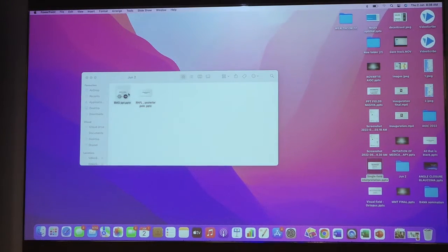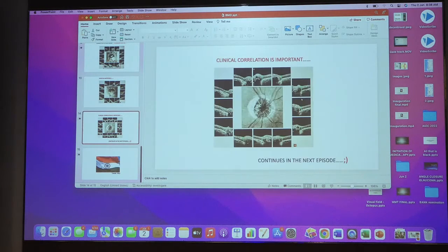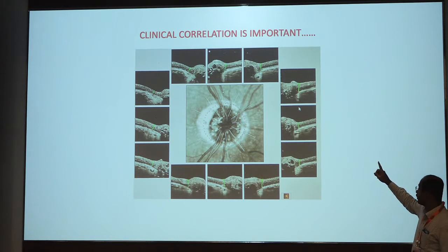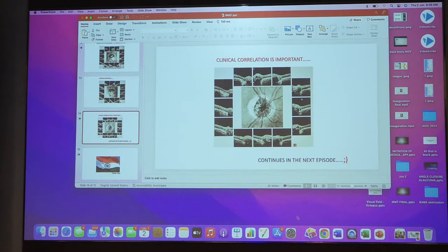So this was the MRW of the last case. Yeah, so all in the green, all statistically normal, all sectors agree, Bruch's membrane opening identified properly, termination, vertical, perpendicular, everything fine, everything normal. Okay, so now I go back to the PPT that I am doing right now, and let's see why Shane Warne will be happy.